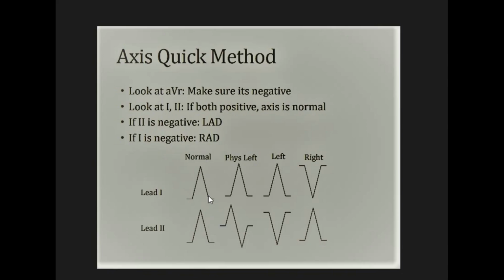Over here, this is the graphical representation of what I have just said. Lead 1 positive, lead 2 positive: normal axis. Now this is another point, and over here I'm going to emphasize that.